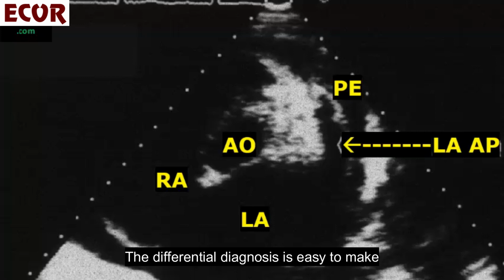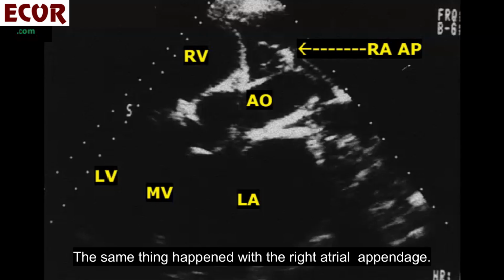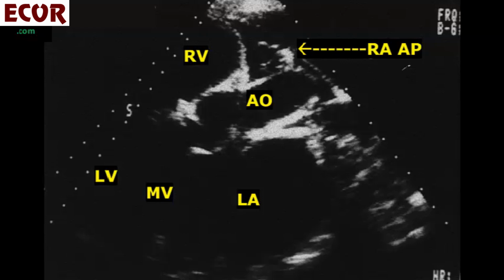The differential diagnosis is easy to make by demonstrating the continuity of that structure with the cavity of the left atrium. The same thing happened with the right atrial appendage. It may be mistaken easily as a mass when seen in patients with pericardial effusion in front of the aorta.